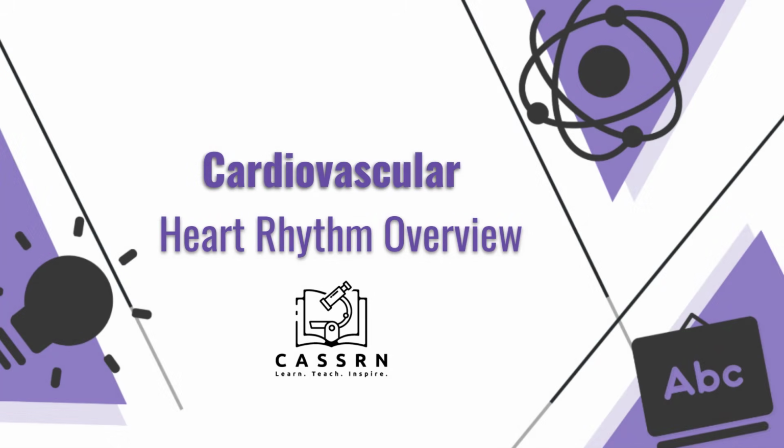Hey everyone, in this video we will be going through an overview of the various heart rhythms and a few other things that you need to know in order to be successful in reading EKGs.